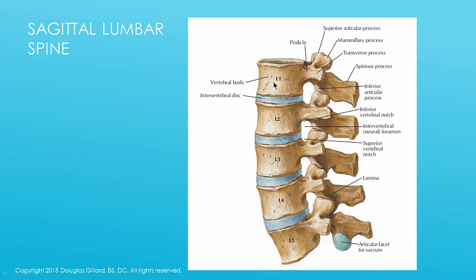But an X-ray is like your spine got run over by a steamroller, so everything is just a two-dimensional picture. So if that's true, which hole would this be? This is obviously the intervertebral foramen, the neuroforamen, but if everything is smashed flat, it's really the right and the left intervertebral foramen together. You get how that goes?